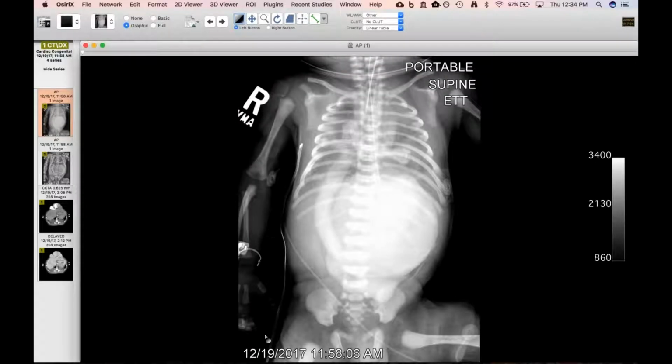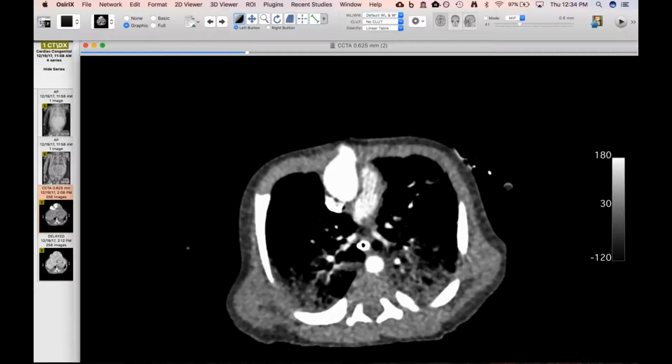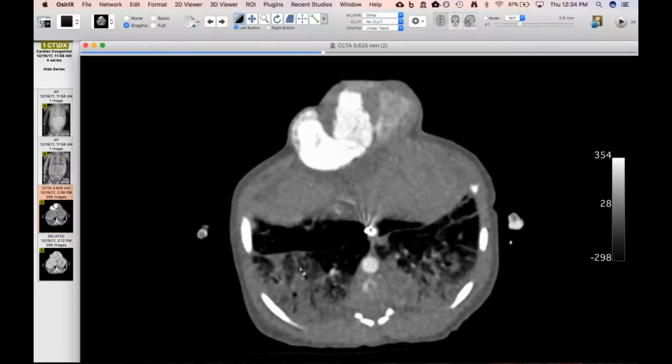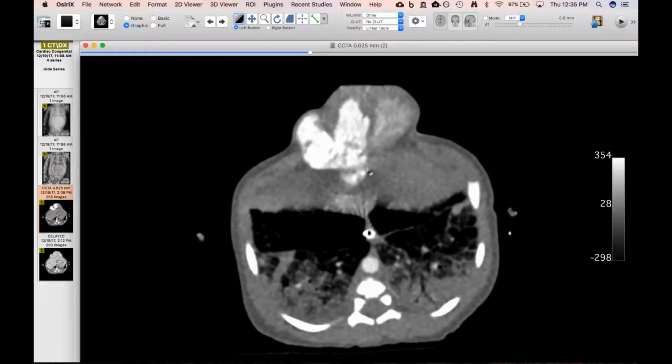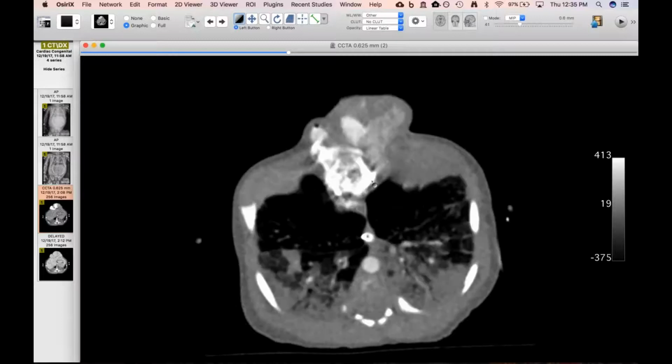This is a newborn. This is day 0 of life, and this is a known diagnosis from prenatal imaging, and you see this big bulge over the abdomen. This is the umbilical cord here, and notice what you don't really see here in the chest where it should be, which is the heart. And you can see on the CT that we did right here that the heart is not where it should be. And of course, this is ectopia cordis. And I'll go through the anatomy here in a second because we're still trying to figure out things ourselves.